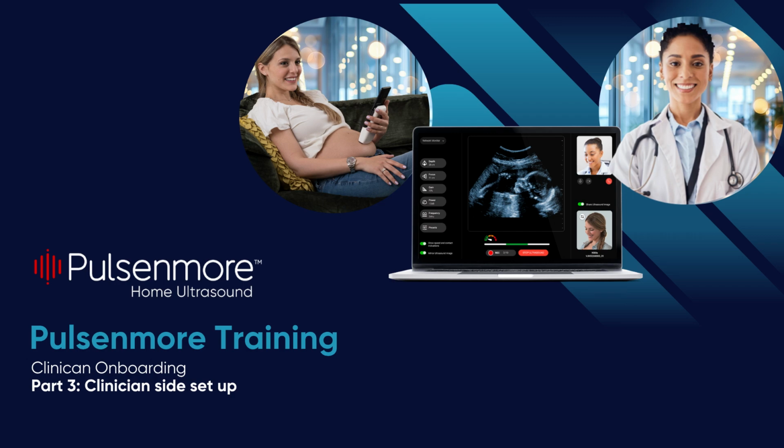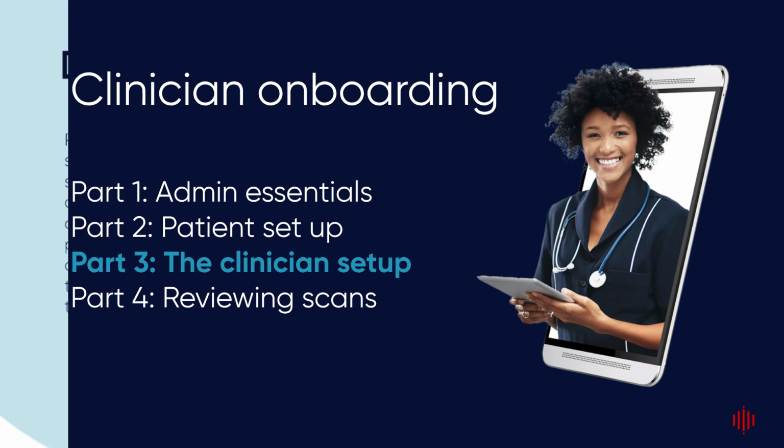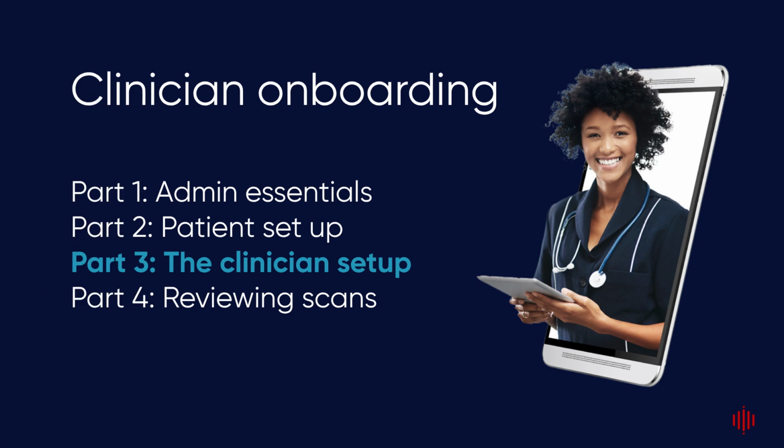Welcome to the third part of the Pulsenmore Clinician onboarding training series. This is a 4-part tutorial designed to guide you through the setup and operations of the Pulsenmore ES ultrasound system for fetal and obstetric applications. In this third session, the focus will be on the clinician side setup of the Pulsenmore system.